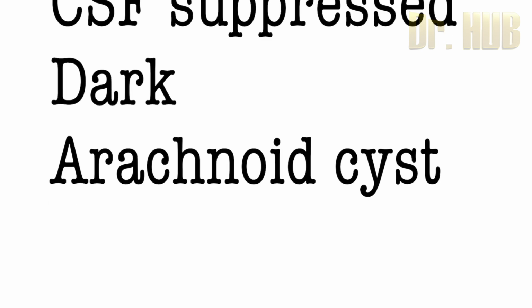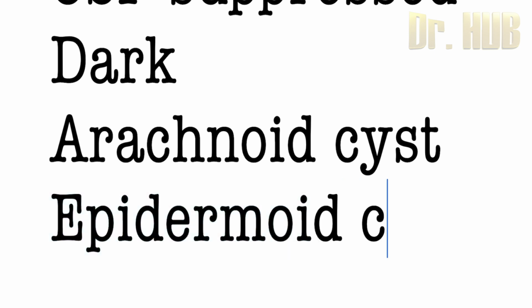Next is the epidermoid cyst. It does not get suppressed on the FLAIR. So you have the epidermoid cyst. This does not get suppressed on the FLAIR.